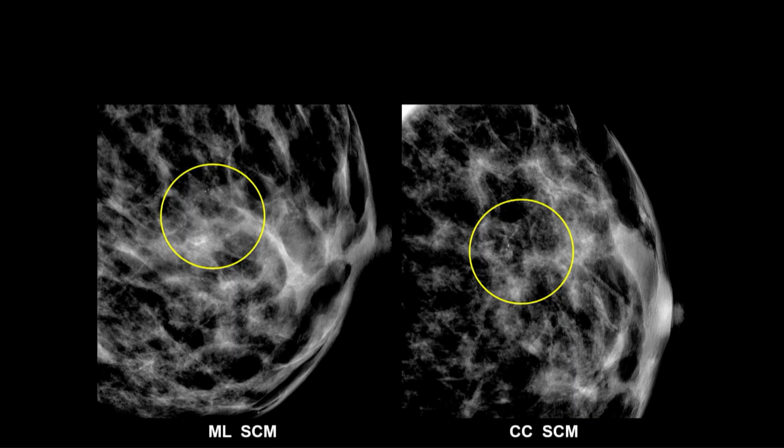That's good. And actually, when you do the diagnostic exam looking at one side, you're supposed to also go back and look at the other side as well and make sure you agree with the radiologist. So do that. It wasn't done in this case, but it could have been done, and it might not have been a bad idea. At any rate, here she is recalled for calcifications.